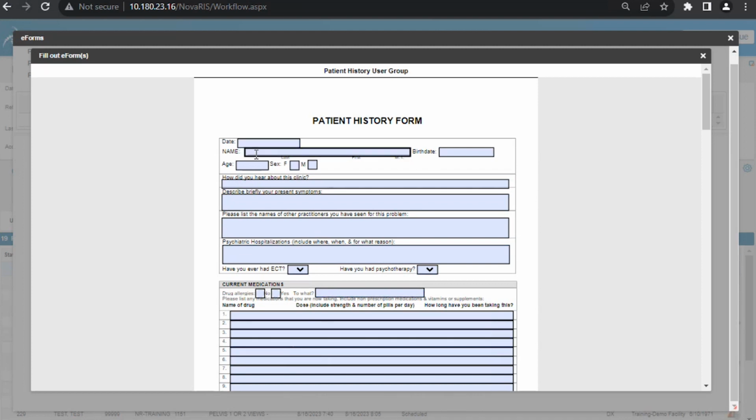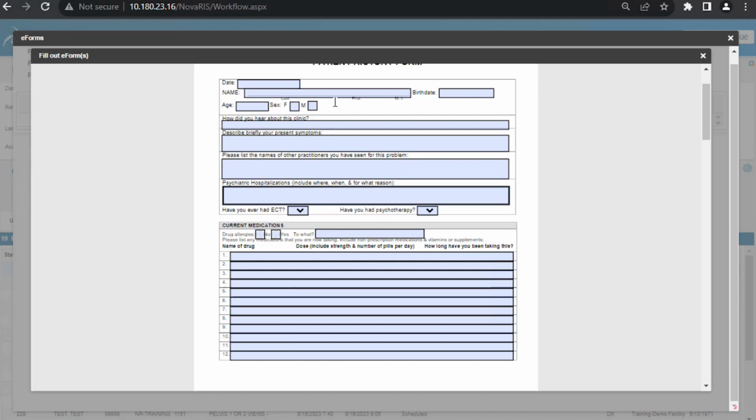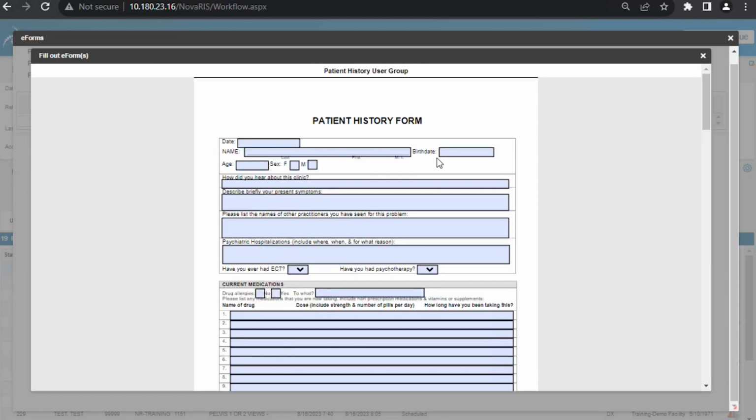But if I go into my PDF document and I link the name for my patient name, the sex for my patient sex information, and any other like phone, address, birthday, once you link that correctly into your PDF version, it will pre-populate it here. So in here, I can just go and, for example, put again Smooth Janice, female, 83 years old, for example, and then you can keep typing all the rest of the information, if they have yes or no, and all that information.